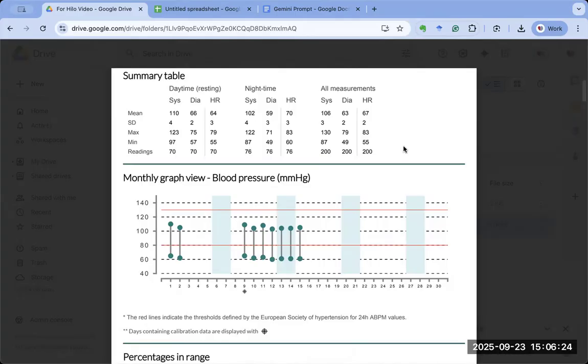The other thing is, in the ideal world, there should be no more than a 2-hour gap between two readings. And based on Hilo's research, they found that at least 6 readings a day for a continuous 7 days at a stretch would be ideal for measuring time in target range and things like that. And I'll talk about time in target range.